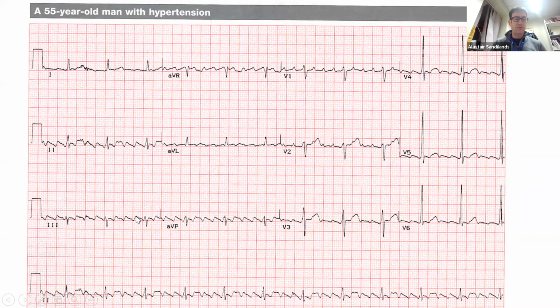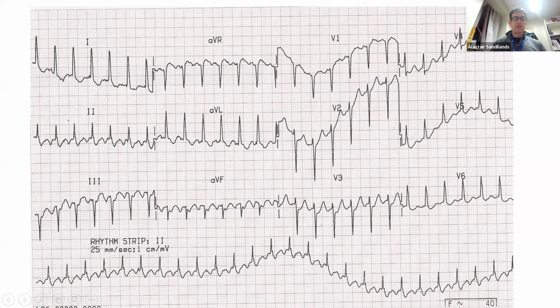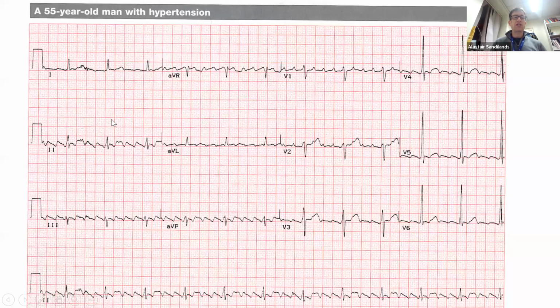This is not a discrete P wave firing off. Okay, this is much more continuous and fluttery. Much more clearly seen now compared to this example. So this is just another example of your atrial flutter, which is 4-to-1, 75 beats a minute. And yes, it's not a tachycardia. Okay, does everyone appreciate that? Any questions?